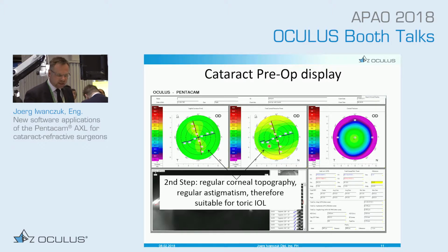It's a very regular astigmatism. But if the posterior surface contributes, it might be that the axis shifts compared to the anterior surface. Or the astigmatism is not that regular anymore, because the posterior surface has a bit of irregularity. So this is a qualitative inspection. Here there's nothing to worry. It's a pure, regular, nice astigmatism with the rule.